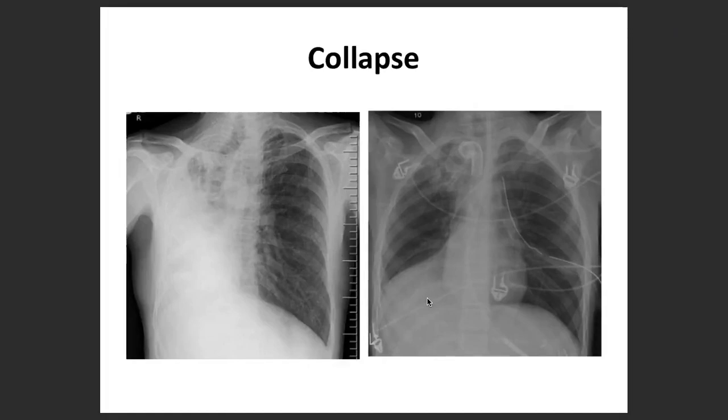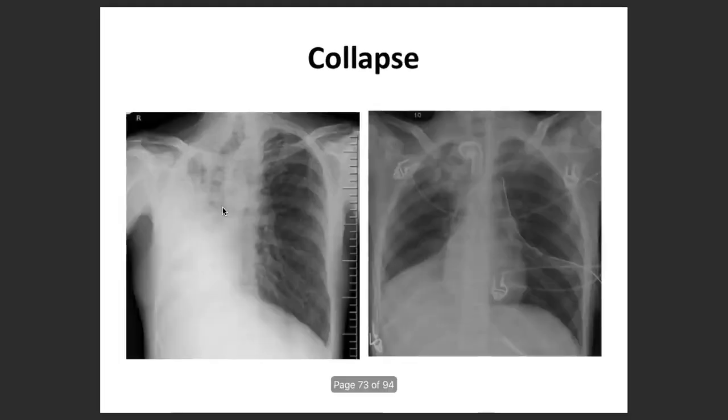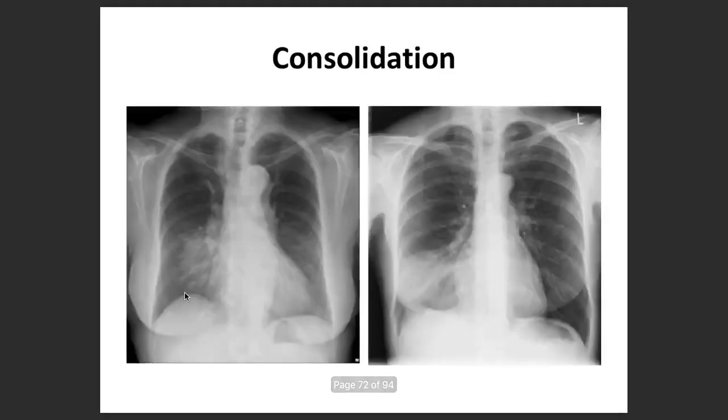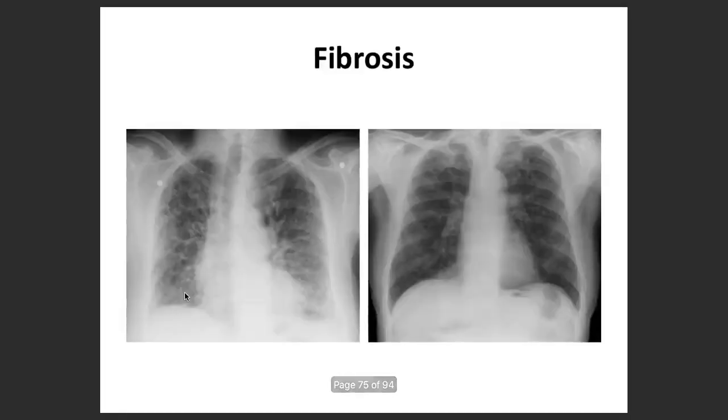So you are all now expert masters in this. These are the different examples, if you see. This is for the right upper lobe. Collapse, yes, exactly, or atelectasis as well. Over here, almost the middle and the lower right side is all gone, so you can literally pinpoint it. That's why it's really important to have a look.